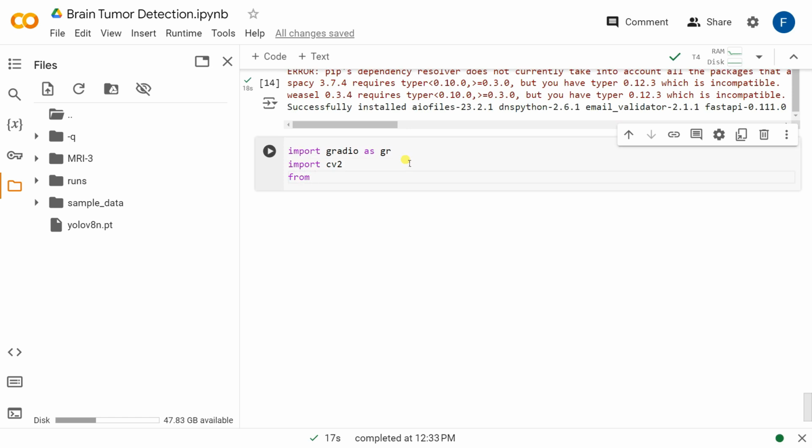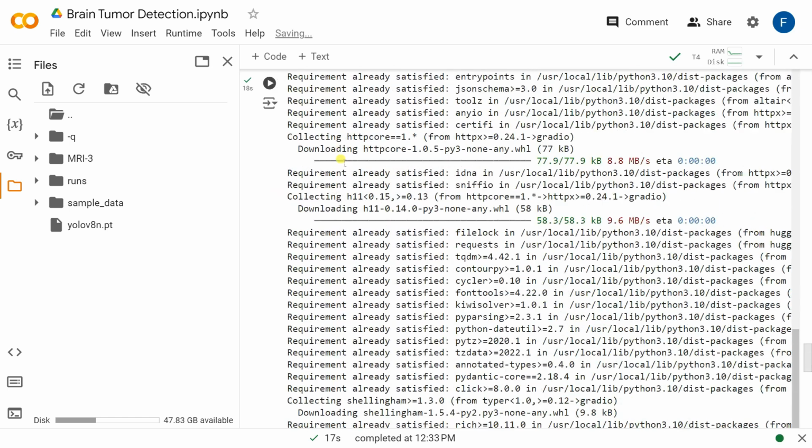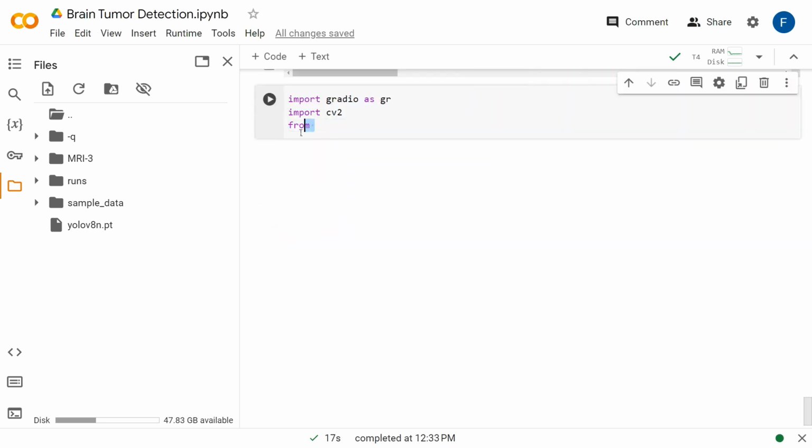Yeah, I don't think the alternative import is needed right now, because you already have the model file in a variable called model. So I don't need to import it here. Okay, I can import numpy as np here. Fine. Now let's create one function called predict, which takes one image.